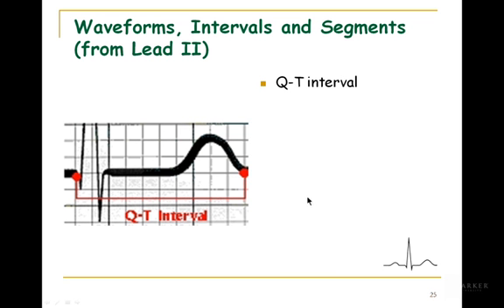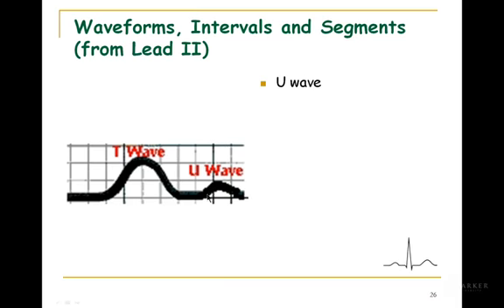Okay. Now the last one is the U wave, and the U wave, we said we could have seen it with hypokalemia, but they call it a wave of unknown origin. It is not necessarily indicative of hypokalemia. Usually, if you start seeing it, it may indicate maybe part of the ventricles are taking a little bit longer to repolarize, or are a little slower than normal, but again, not very indicative or diagnostic of certain conditions.